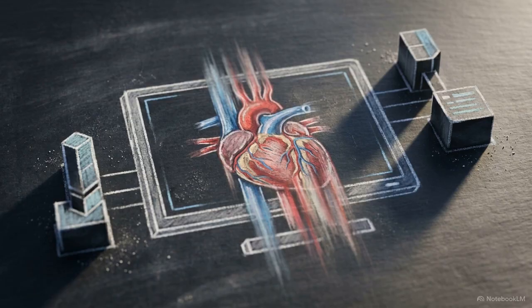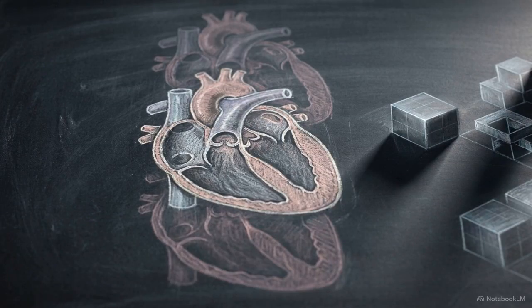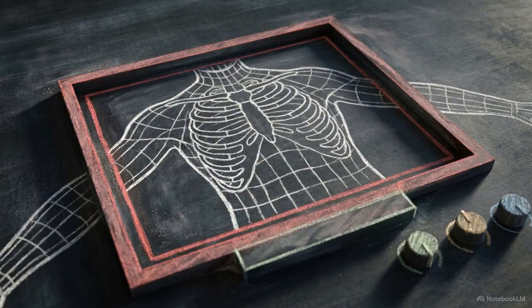Because the error happens entirely within the slow vertical sequence, the resulting artifact is highly directional. The scanner projects asynchronous, low-intensity copies of the moving anatomy strictly along the phase encoding axis, creating the visual stutter known as ghosting. This axis is equally vulnerable to spatial boundary errors.